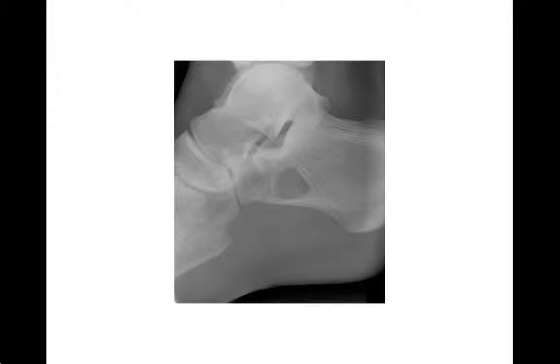All right, so this is a radiograph of the calcaneus, and there are two main calcaneal tumors you're going to see which occur in the anterior part of the calcaneus, right? So we'll just draw a line bisecting the calcaneus, and anterior is this half and posterior is this half. And when you see lesions in the anterior part of the calcaneus, these lytic lesions that look like this, there's two main things you're going to think of.